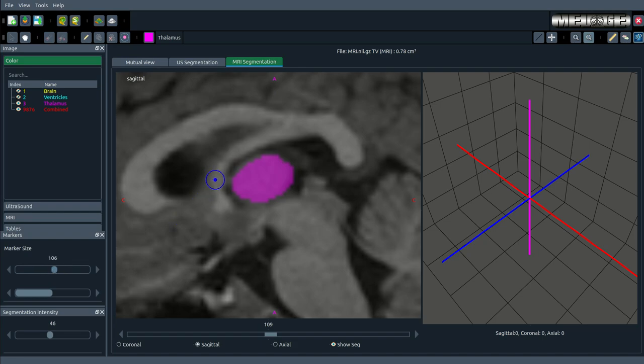Then I can use this tool to segment the areas that I am interested in. For example, here I am doing it like this, and it starts, and interactively it segments the areas that have the same colors or the same patterns that appear there.